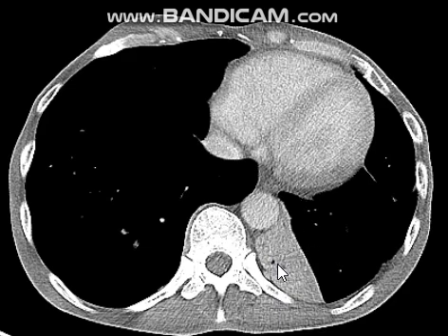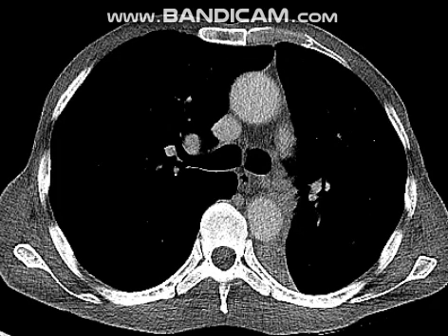Now you need to check for the cause of the collapse. You need to look at the left lower lung lobe bronchus. As I mentioned before, the left mainstem bronchus, first horizontal branch on axial view, is the inferior segment of the left upper lobe bronchus. Why? Because the superior segment is vertically oriented and can't be seen in line with the left mainstem bronchus.